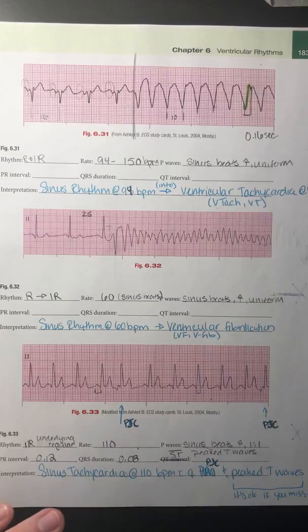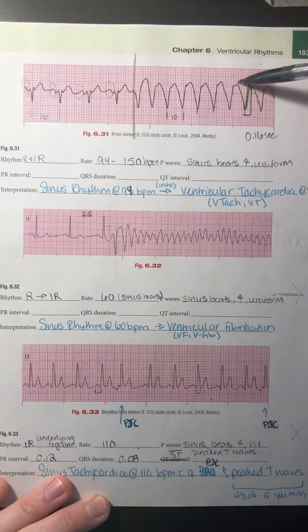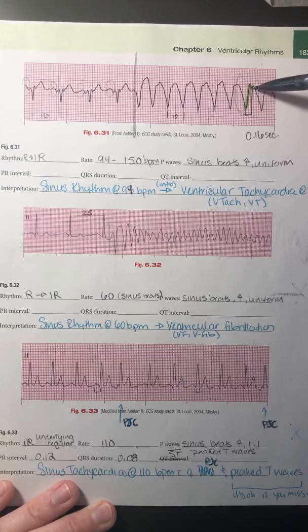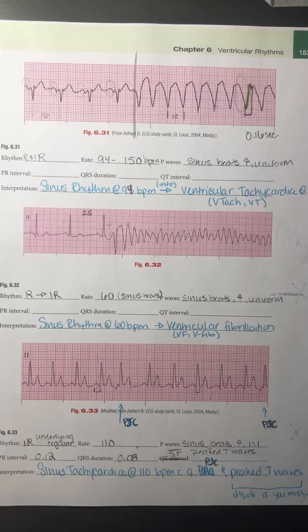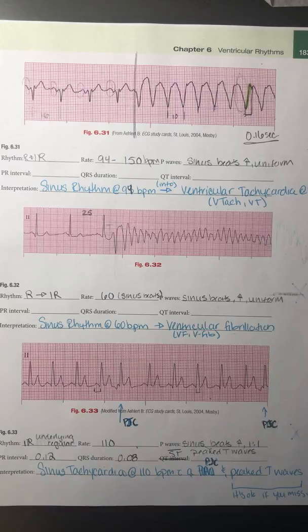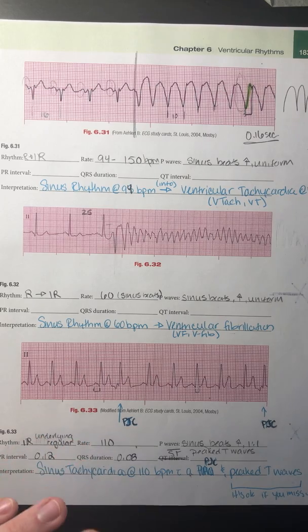The QRS complex I highlighted in green here. So where my QRS, okay, actually is. It's just this little segment. And this is all going to be that kind of weird reflection of that backwards energy. So QRS is actually only from here to here, so it's actually only 4 blocks long. So for this section, it would be 0.16 seconds. Again, we don't usually count out the QRS duration in V-tach because it's a very distinct looking rhythm. We can definitely just look at that and see that it's a V-tach. And sometimes it looks very regular.